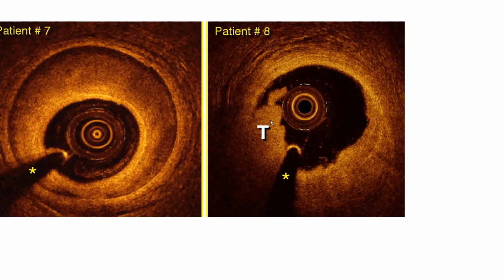Here, the authors consider that as a SCAD, but I'll tell you, if I look at this myself, it looks to me like a thrombus, particularly probably red thrombus with shadowing behind it, overlying an intact arterial wall, intact intima. So I would call this plaque erosion myself. Again, here the wire shadowing confuses the picture, and the plaque here would seem to me lipid rich. So I would call it thrombus, plaque erosion on top of lipid rich plaque. That's how I would call it. But that's why you need to have experience in those.